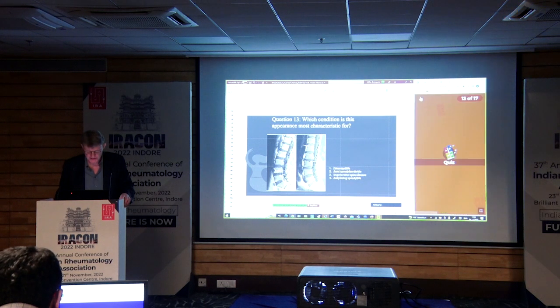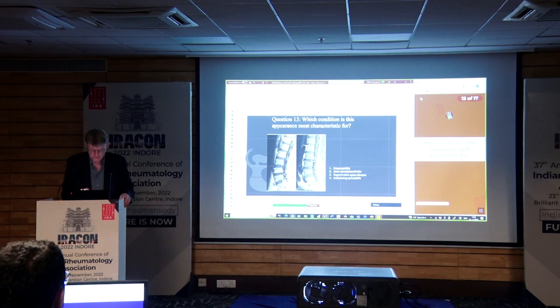So, which condition is this appearance most characteristic of?